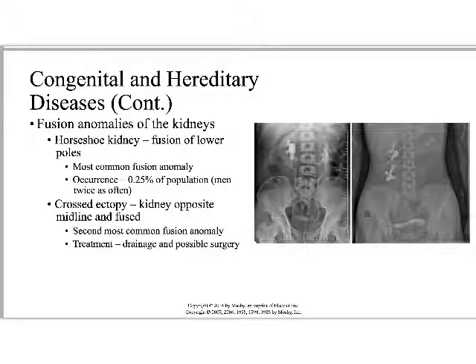So we can see on this other image here, the kidneys are both on the patient's right side, and it looks like there's possibly even a single ureter draining into the urinary bladder. So we can have it where there's two ureters, like here on page 231, from each of the crossed kidneys, or we could have a single ureter. Anytime we have an anomaly like this, there's going to be different types of anomaly, right? If either one of these is causing discomfort or problems with the function of the kidney, it may need to be treated surgically or in some other way.